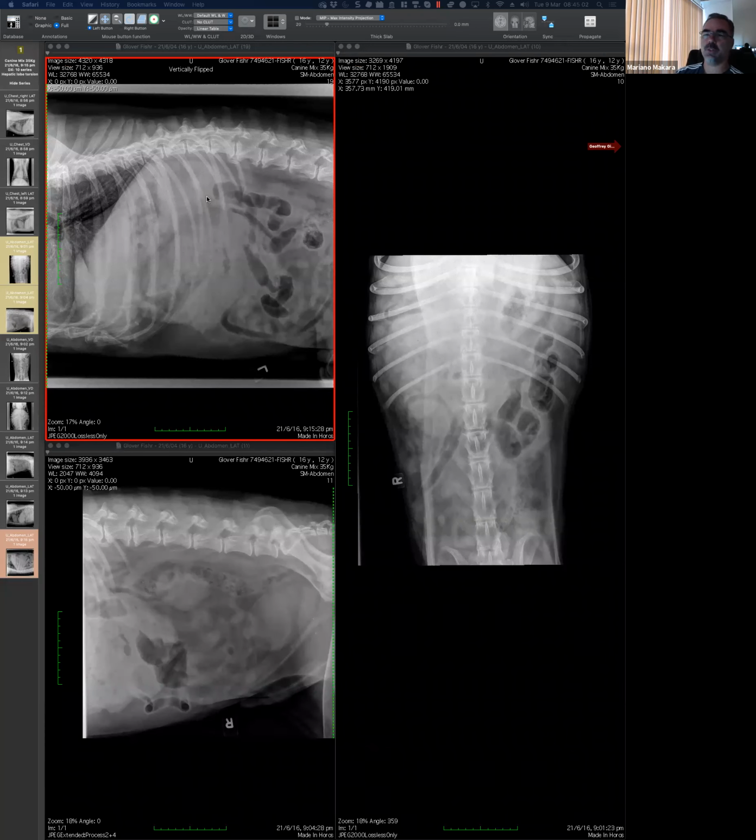But I thought about sharing this, because we were going through the theme of torsions. And we still have a couple of torsions to go through. I will make sure that we throw them into our cases. But we went through colonic torsion, splenic torsion. Now it was the time for a liver torsion, liver lobe torsion. Very unusual. Again, I don't think you should make the list of differentials any narrower than we've done. But it's just to share an interesting case.